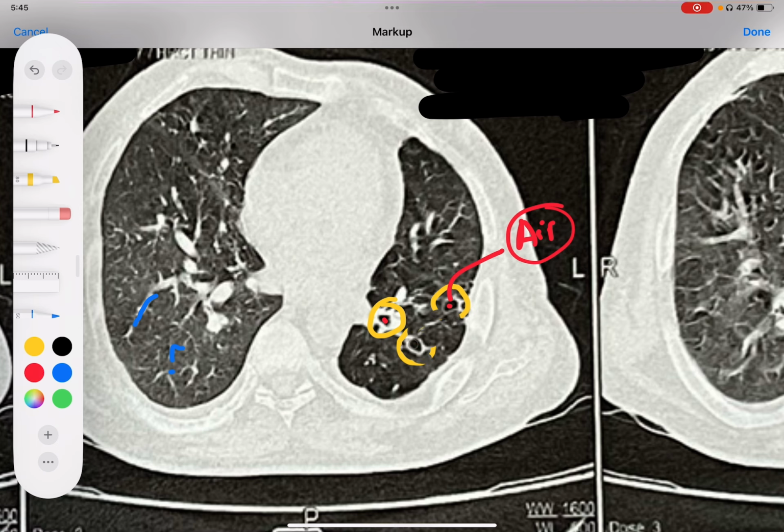It means this is bronchus, because in lungs air is present in alveoli and bronchus and trachea. So this is periphery, means this is not trachea. This is simple bronchial divisions, and alveoli will be very small. Alveoli will be much smaller than the dots that I'm putting. So there are crores of smaller alveoli in all these lung fields. I cannot make a smaller dot than this. The alveoli will be that much smaller.